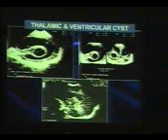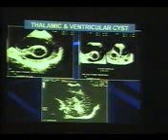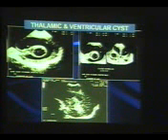Then not only that, at times we can get a cystic lesion. This is a thalamic cyst. Again, gross hydrocephalus. This is the thalamus. This has happened due to an ischemic insult. Due to the ischemic insult, flow obstruction to the thalamus, we got ischemic necrosis, resulting in the thalamic cyst. And this is a choroid plexus cyst, which is an incidental finding. This is the choroid plexus, and this is the lateral ventricle, and this small cyst seen over there is a choroid plexus cyst.